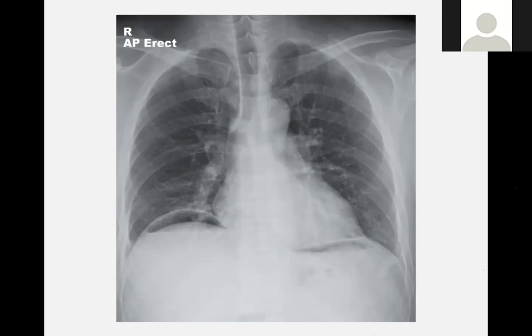What else? You have lung markings. Inspiration looks 1 2 3 4 5 6. Six, is it okay? Because 7, no. So yeah, because it's 6, you would say it's not adequately inspired. So the inspiration is not enough because you can see it's about 6. Let me count again: 1 2 3 4 5 6 7. 7 posterior ribs. So that's less than 9. You need to have 9 at least. So yes, low inspiration. And then ABCD.